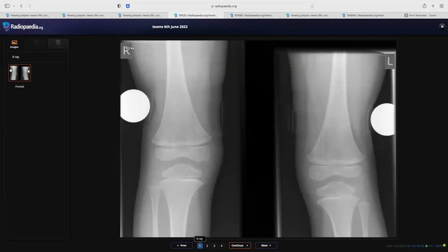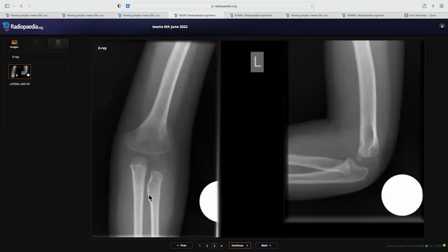Actually, I don't remember the findings in the knee joint of Nail-patella. Maybe widening of the intercondylar notch in this. Okay. And this is the X-ray of the same patient, another X-ray. So what else will we see in this? It's okay if you don't remember the entire series, but it's a congenital problem that you have mentioned.